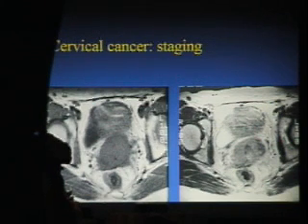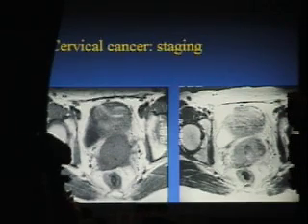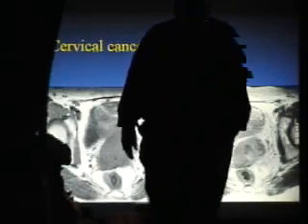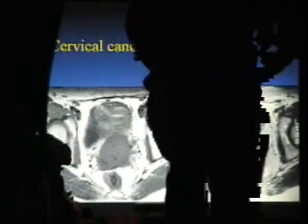Okay, so once we've done size and volume, and volume is incredibly predictive of prognosis nowadays. If the volume is bigger, the prognosis is worse. And so it's very important to do your 3-axis measurements. The radiation oncologists, particularly important for them. As you know, they love measurements like all oncologists, right?